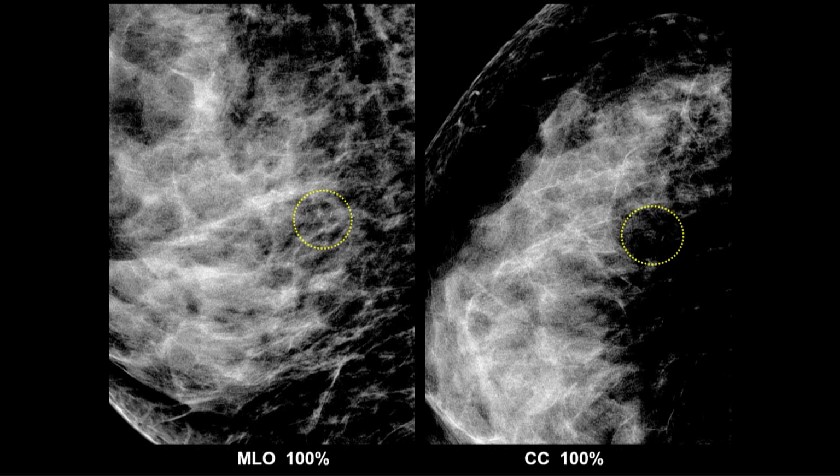When I annotate my images on the slides, if it's reasonably readily visible, it'll be a solid line. If it's a little bit less visible, it'll be a dashed line. And if it's really hard to see, it's going to be a dotted line. So this is a clue to you that this is hard to see. You can see it on the workstation, but it's really hard to see on the slides. You can probably see there are a few little white dots there.